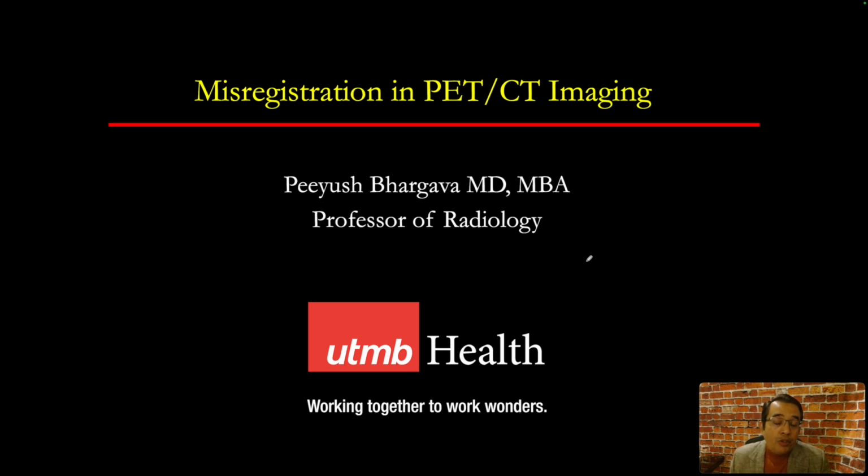I'm going to show you some examples of misregistration on PET-CT. Misregistration is common on PET-CT images as PET and CT are acquired at different time points, although in the same scanner.